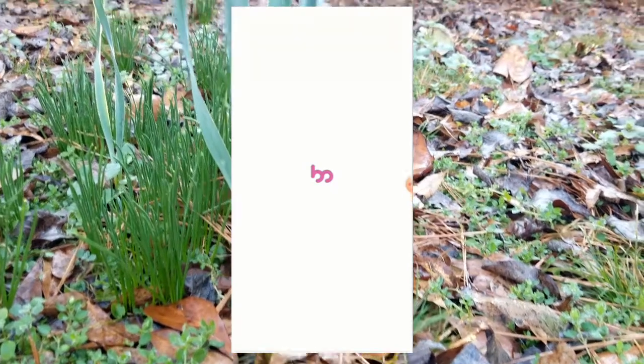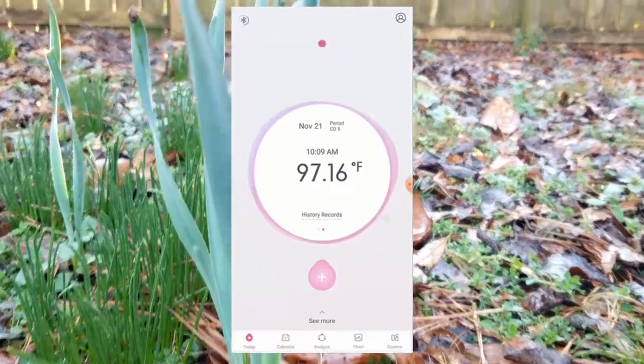If you're not interested in trying to conceive, or if you are not interested in fertility, you can still use this app and not use the basal body temperature aspect of the app. It still has lots of things to be used for, and I'm just going to show you the app and talk to you about it through there, so that way I'm not rambling so much. But love that app, love the data, super great. So we're going to start out with the app, and this is the home screen.